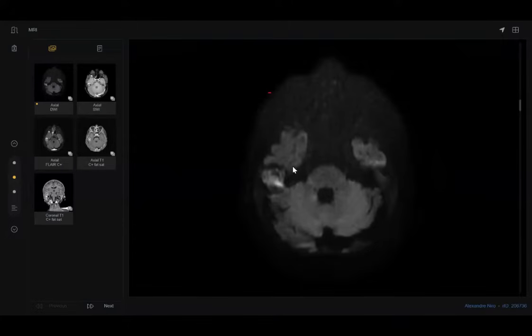So I can't think of anything else, I think it's because of the fat fluid level. I'm thinking along the lines of teratoma. However, there was expansion of the neural foramina, so the schwannomas and nerve sheath tumors would likely do that mostly, but they do not have these fat fluid levels in them, and there's a solid enhancing component. Sir, I'm thinking along the lines of teratoma and a malignant dermoid.